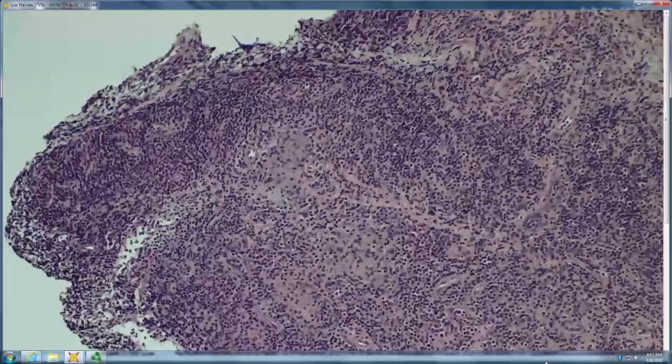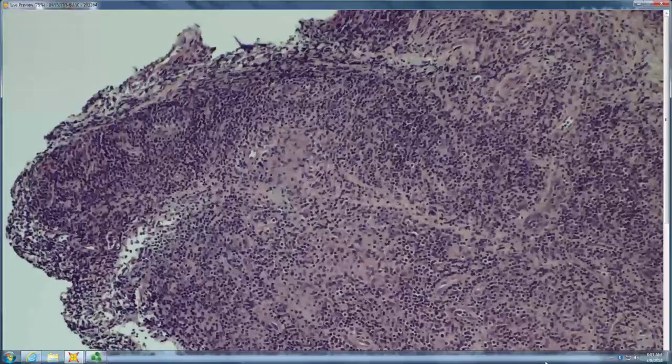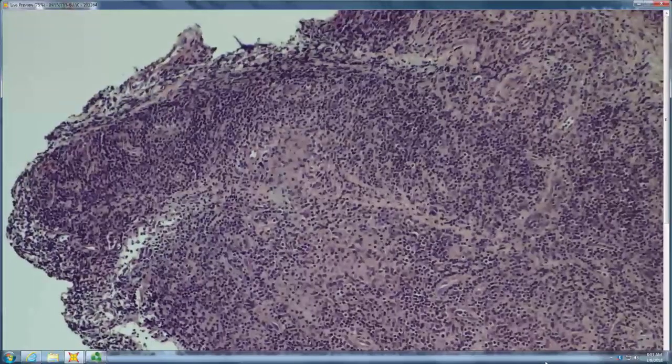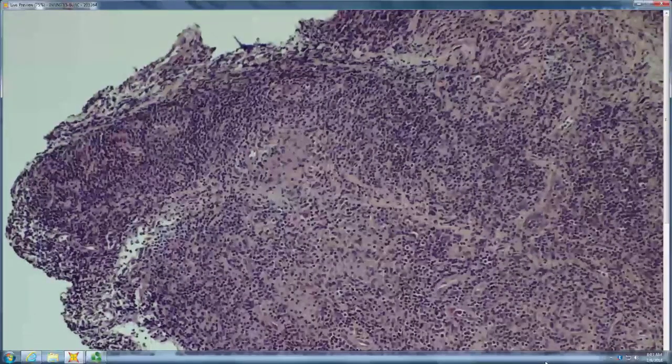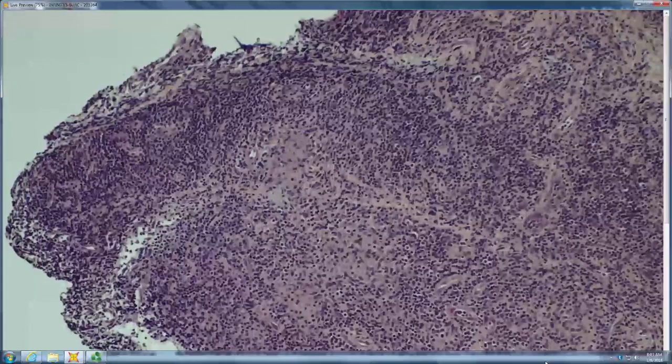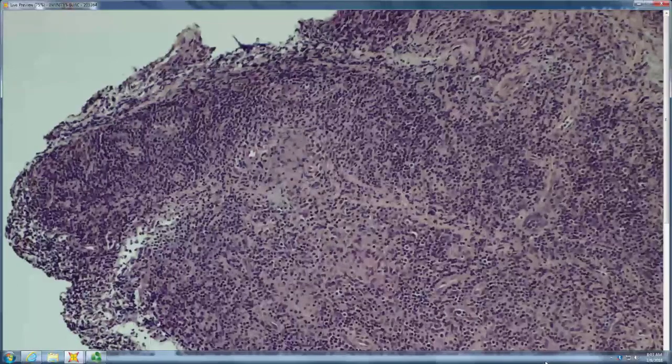Yeah, so lymphs surrounding granuloma. So is this more sarcoidal or more tuberculoid? Tuberculoid. So this is tuberculoid granuloma. And what things can cause tuberculoid granulomas? Obviously TB, that's where it gets its name. What else? Tuberculoid leprosy absolutely can. That's why it's called tuberculoid leprosy.